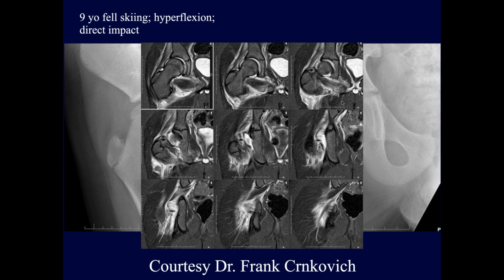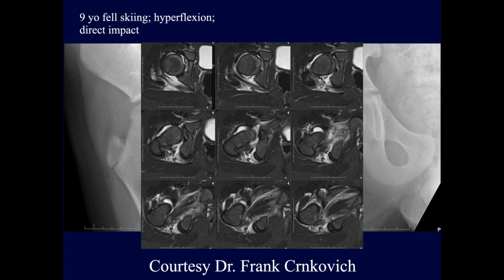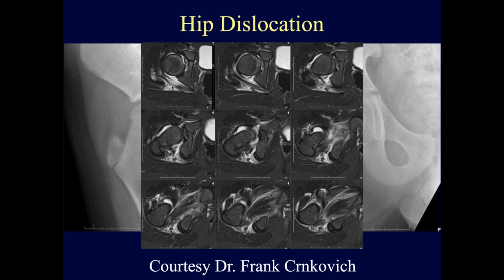So we have extensive pericapsular edema, and especially the posterior capsule is injured. I'm wondering if he had a dislocation and it popped back in place. Yeah, this was a dislocation that popped back in place, and you can see the posterior capsule is torn here.